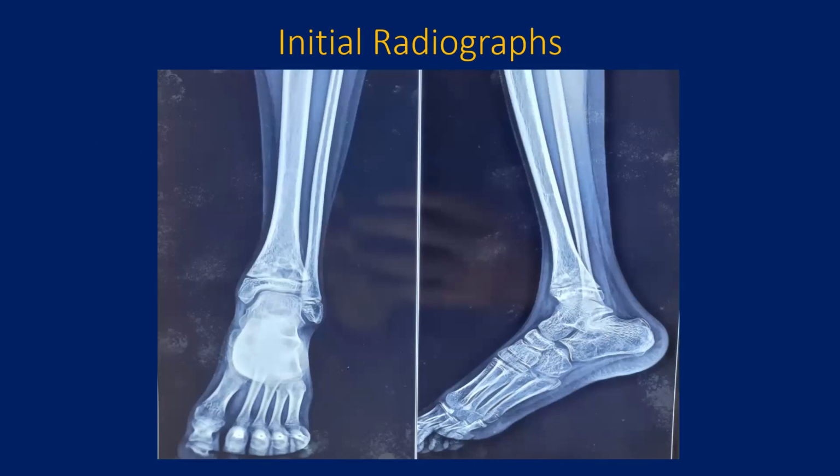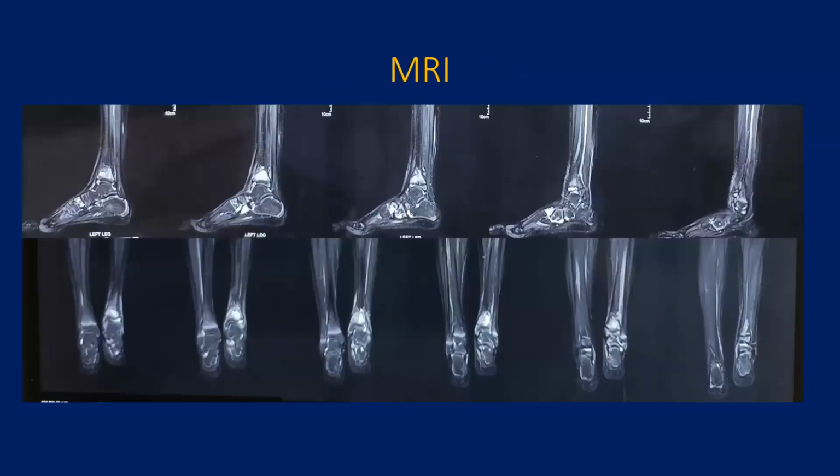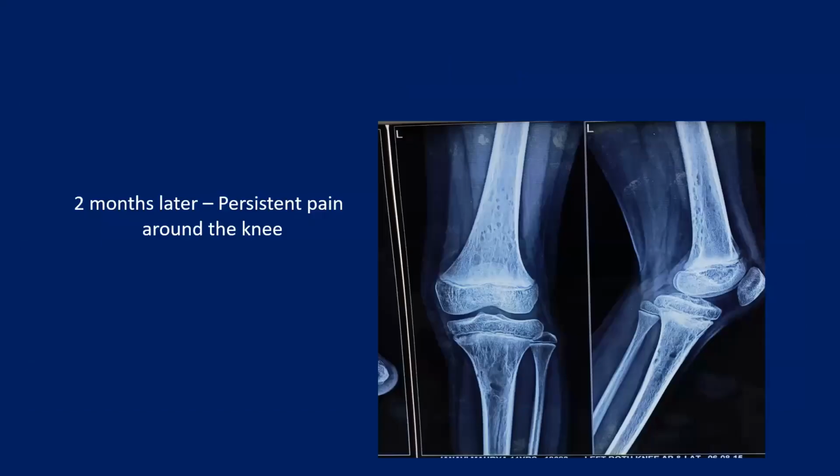So the first thing I thought is infection. True. And yeah, Joyance, let's go further and tell the whole story. Okay, so these were our initial differentials, and we got an MRI done to evaluate further. And due to paucity of time, I'll just rush through this. Initially we got a core needle biopsy done, which was inconclusive.